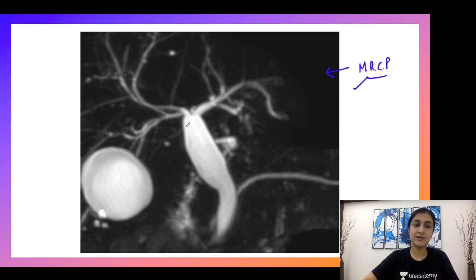What are we seeing here? So this is the biliary duct which is completely dilated. Can you see a fusiform dilatation? A fusiform dilatation of the CBD. This is the main pancreatic duct which is normal. This is the normal MPD, and these are the normal intrahepatic biliary radicals. Alright, so IHBRD completely normal. And what is this round structure? This is nothing but the gallbladder.